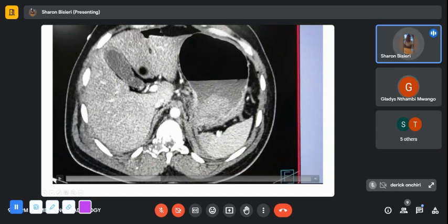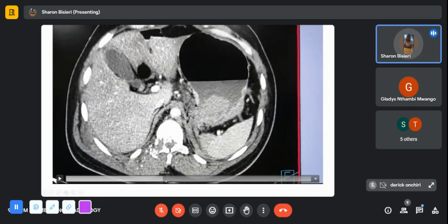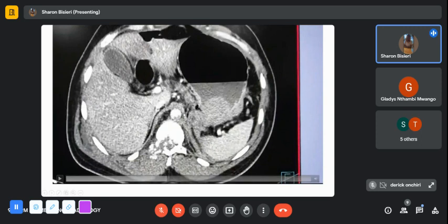We also noted that the gastric contents are more dense towards this posterior aspect, and that is what made us think more towards a ruptured posterior wall of the stomach. In the adjacent diaphragm, there are some air locules, better seen on other windows, and then there was an obvious break in the diaphragm on this aspect. There's a burst fracture. I don't know if you should call it a burst fracture, but the vertebral body was totally shattered.